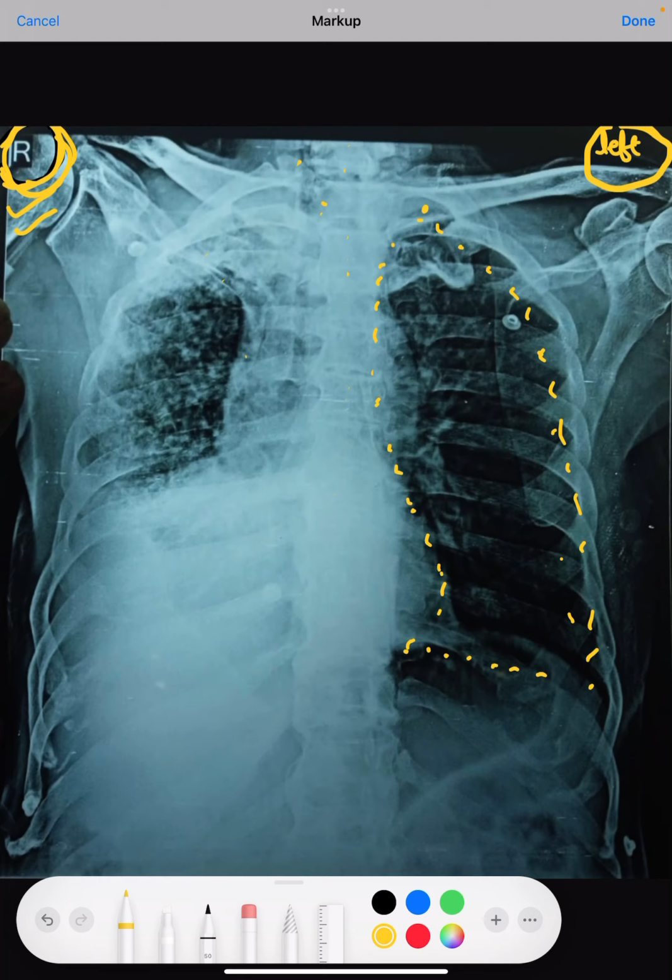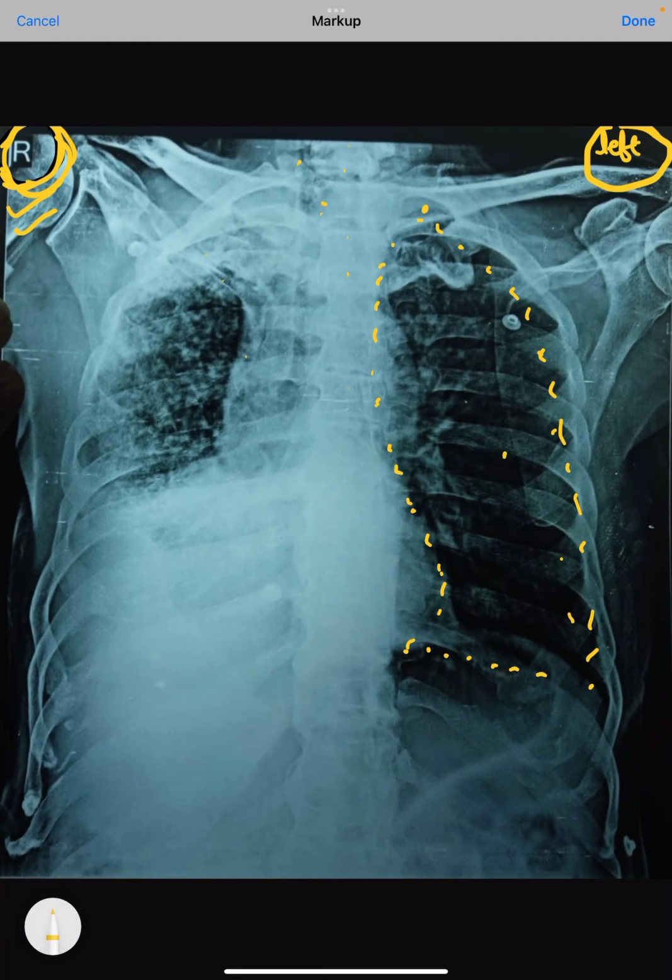The other thing which does suggest fibrosis or restrictive lung disease is the space in between the ribs. So the intercostal space is very important. Here we can see the space is from here to here. So this is the space. This is basically a rib. We can very nicely make out this is the rib and this is the rib, and in between is this space.